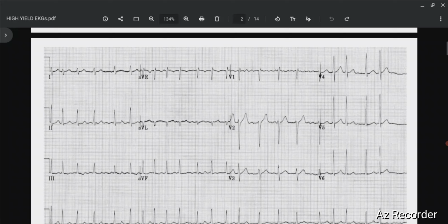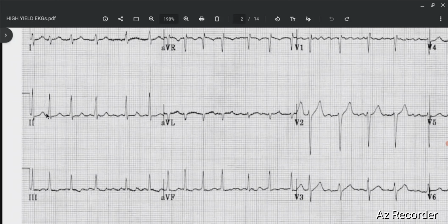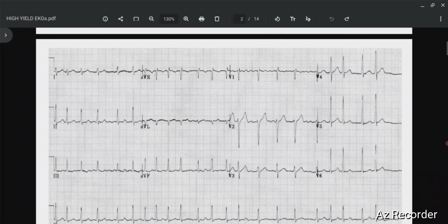See what is happening with your P wave. If I see, actually I cannot find any P wave. There's no P wave, and the rhythm is irregular. Oh, I find some bizarre waves present between two QRS complexes. So I have pretty good points to diagnose this ECG. I have an irregular rhythm, no P wave, and bizarre waves present between two QRS complexes. My diagnosis will be atrial fibrillation, obviously.